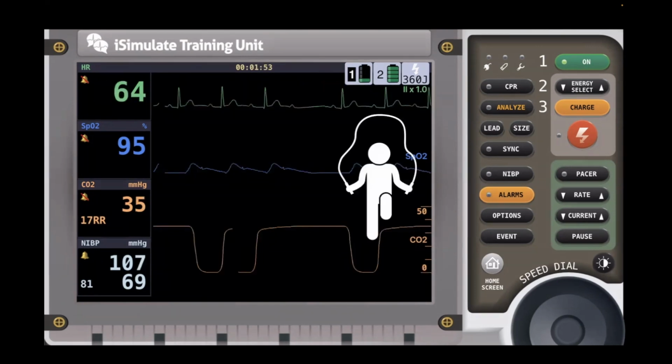How about this one? So we have our P, QRS is narrow, coming from the top. T waves recharging. P, a little bit longer PR segment, narrow QRS, T waves recharging. P, longer PR segment, narrow QRS, T. P, no QRS. So this one skips. This one has a dropped beat. You see it here too, right?